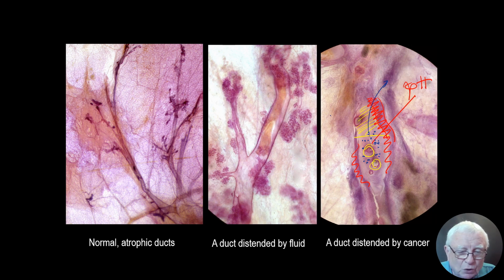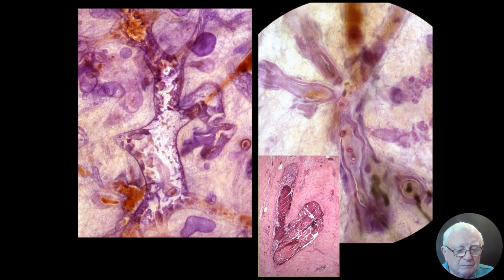What is in the nuclei? What makes you that individual person? DNA. And this means acid. So the pH is not alkaline, it's acidic. And that results in these ominous calcifications. And if we are lucky, then we see these Y-shaped, fragmented casting type calcifications.